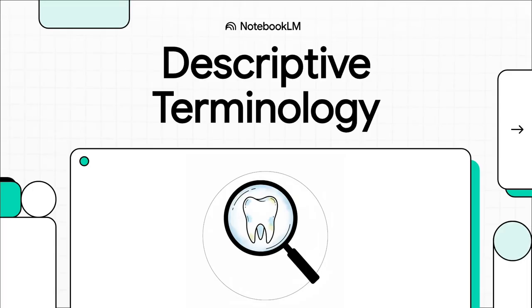Hey there. Ever glanced over your dentist's shoulder at an X-ray and thought, what am I even looking at? It just seems like a bunch of gray smudges, right? Well, today we're going to pull back the curtain on all that. We are going to learn the secret language that dental pros use to talk about exactly what they see, turning that confusing image into a story that actually makes sense.